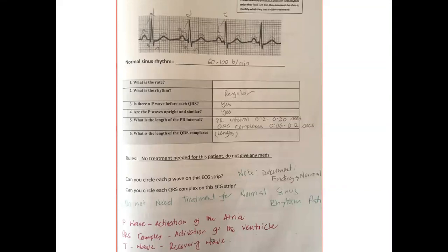Keep in mind, NCLEX may give you a question with a rhythm. So when you get the strip, just take a look, just like this picture. It is called a strip. You must be able to identify what they are and what the treatment is as well. But very few come on the board.